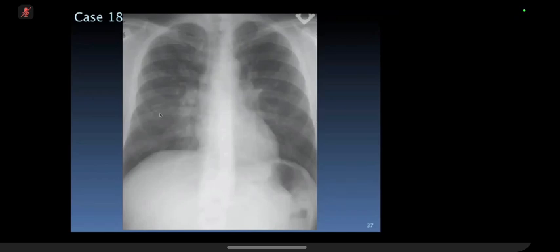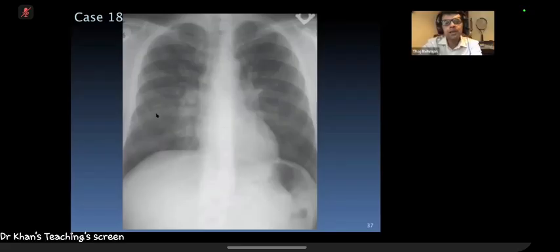Why? So I think there'll be a lot more involved with LAM and LCH, I think. Yeah. There will be a lot more cystic abnormalities in LAM, and they may involve the peripheral lung as well, whether this is more central. So for the benefit of others, I'm showing the cystic rounded opacities in the lung, and they're kind of predominantly central, mainly upper and mid lung, but there are also tram track signs.